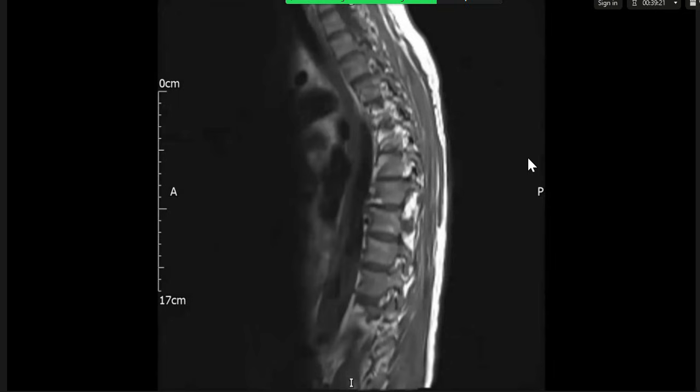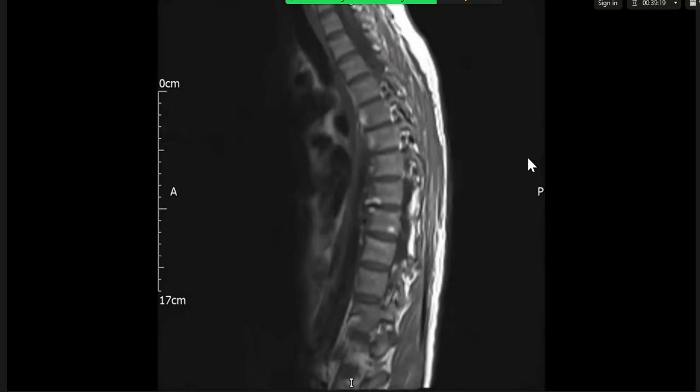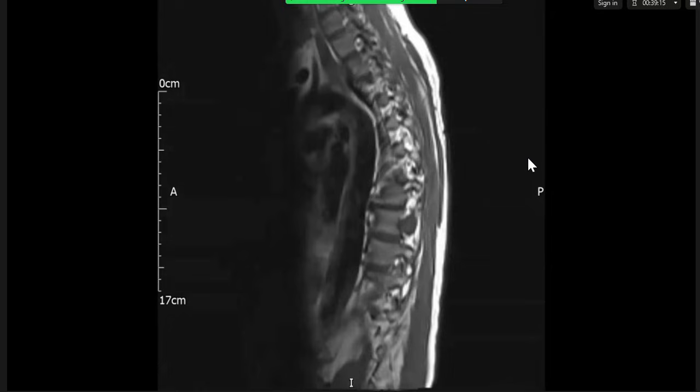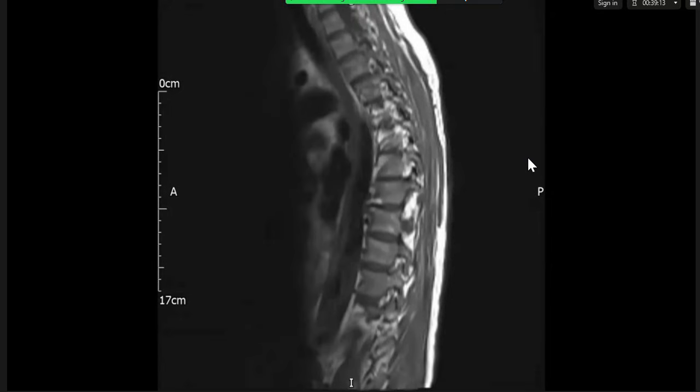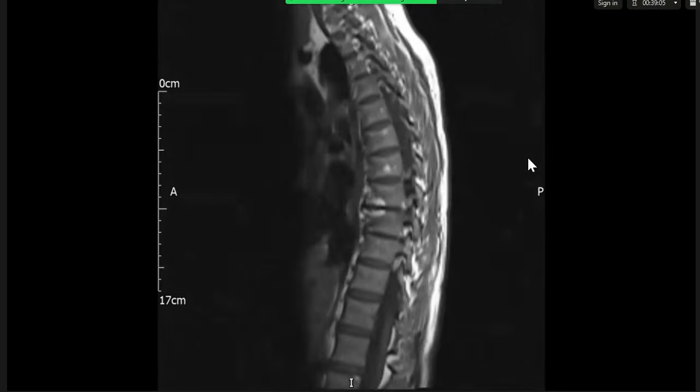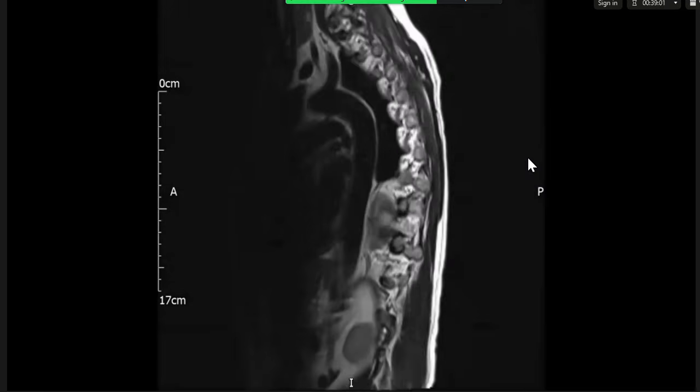So I think it's either passing through a neural foramen, or it's potentially actually arising from this, this is the location of the pedicle. Please continue. Go to the next series, please. Okay, I'll just scroll through. Yeah, I think that was actually emanating from the pedicle.